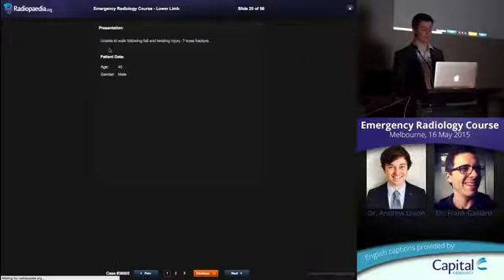All right, 40-year-old male, unable to walk following a fall and twisting injury, looking for a fracture.